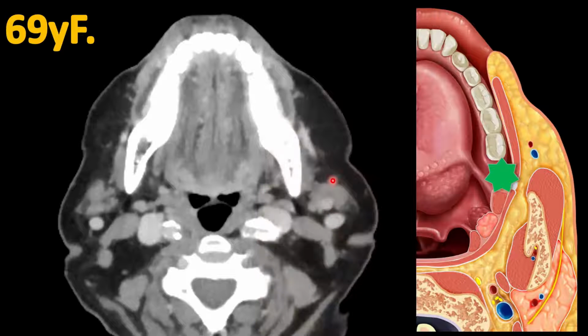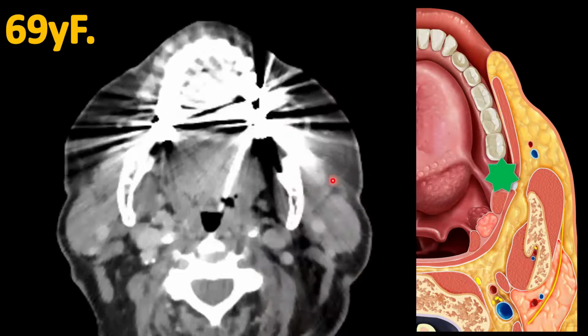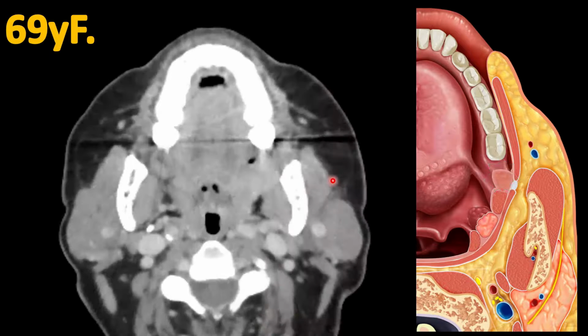So in this patient, this is a 69-year-old woman who actually has a left retromolar trigone tumor. And this was actually missed on the radiology report. And part of the reason it's missed is because it was just called an oral cavity tumor. And, you know, sometimes it's really hard to see. And this is truly her slices. I'm showing this because this is the reality of imaging. Head and neck can be really hard when you throw in dental amalgam on top of everything.